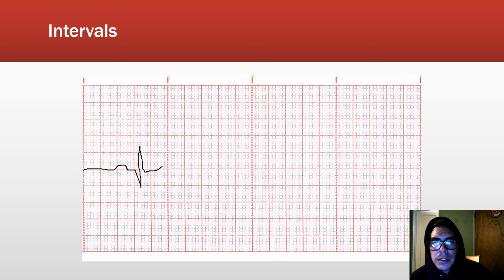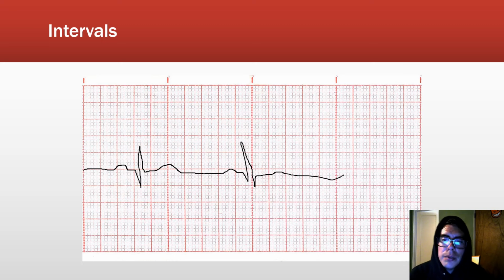So we have an RR interval, which is the first one. And that is, again, the peak of the R wave being up here.